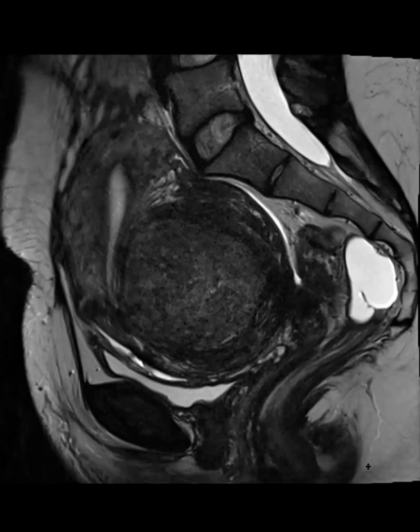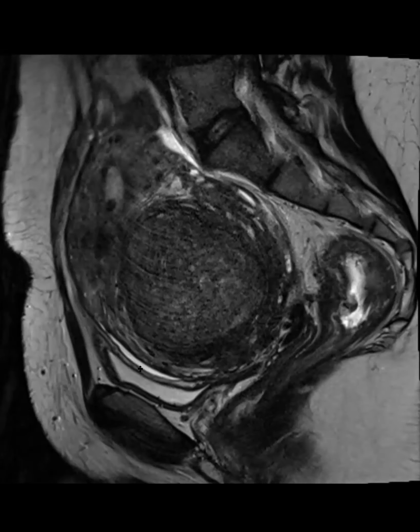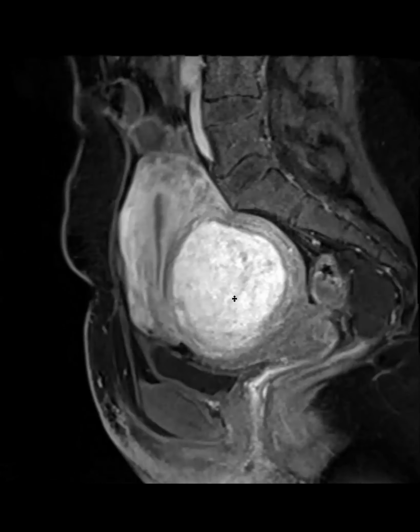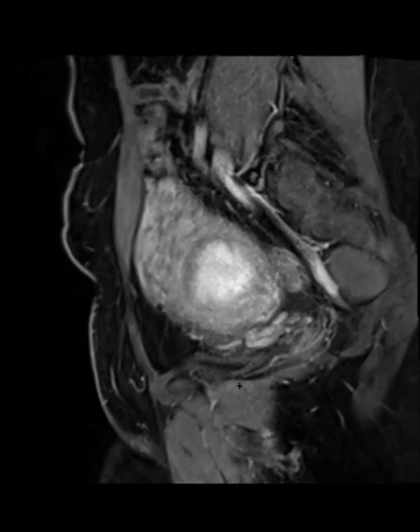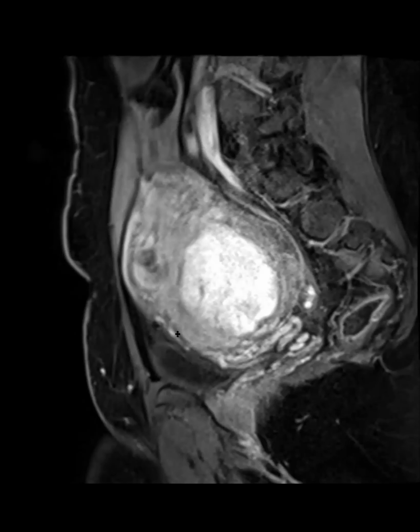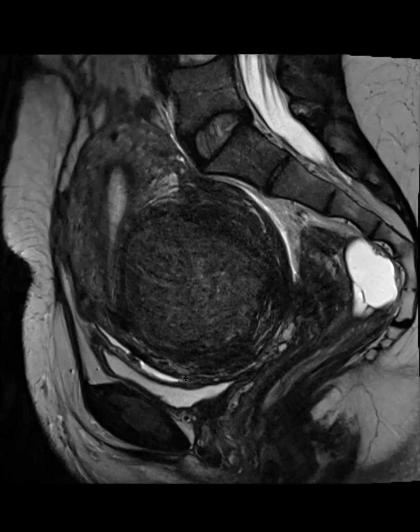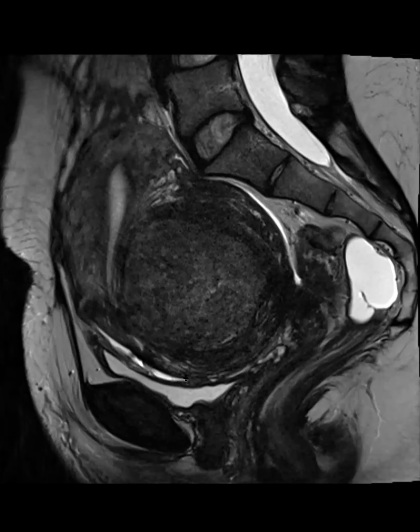There are big fibroids. One of them looks very dark. Yes, there is a large fibroid. This is our typical finding. I think there's scarring between the posterior uterus and rectal wall. So that's like an endometriotic deposit. Endometriosis, yeah. Yes, exactly. And the mushroom sign. Yes, this is exactly what this is. It's a mushroom sign right here.